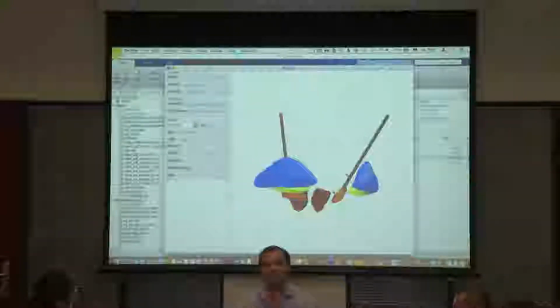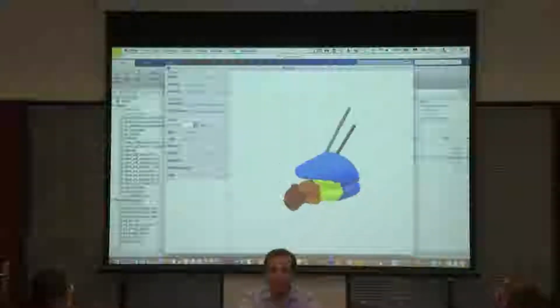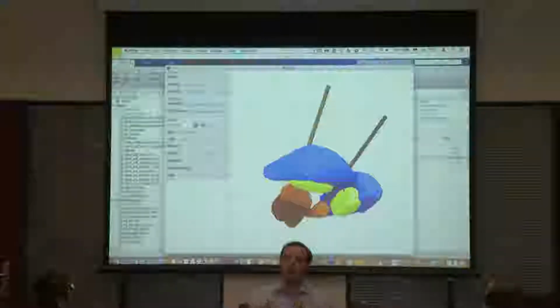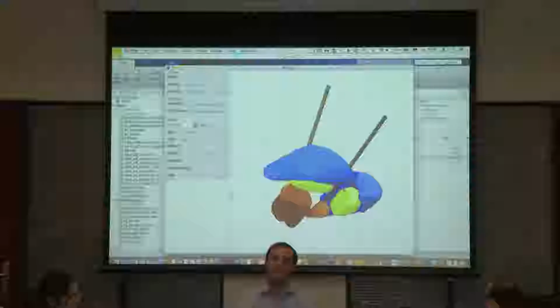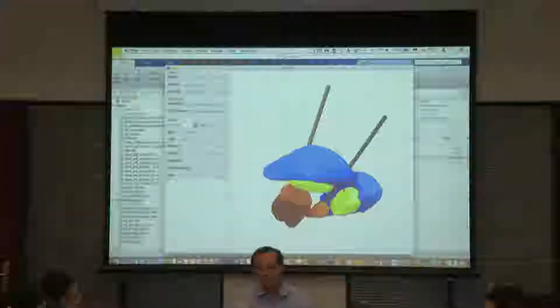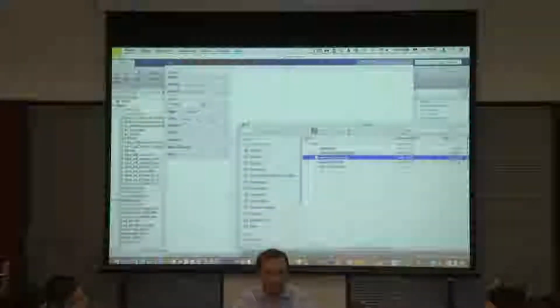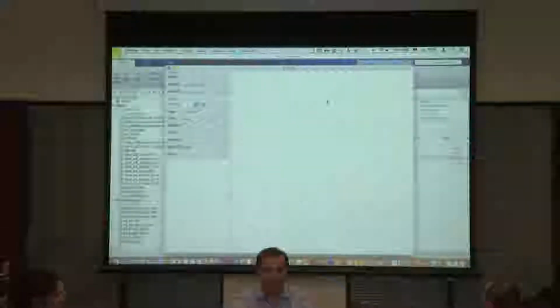So this is also a way to share the results with people. It's maybe not as convenient as a PDF for clinicians, but you could use it in 3D Slicer or whatsoever. And in Berlin, we created a web server where our clinicians can now look at these results from the intranet, right? They have a database, and they have these 3D reconstructions that you can see in the web browser. It might even be that you can directly open these in Chrome. I wouldn't be surprised. No, you can't. Okay, but there are viewers on the web where you can open these.